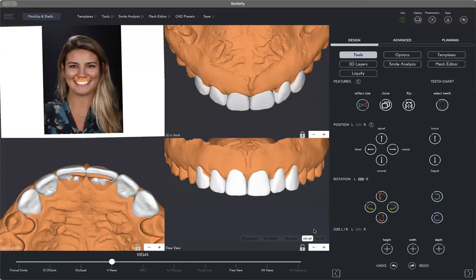everything could be fine, everything could be in the right place and in the right angulation, but it's better when we have a tool to check all the studies and all the angulations and everything in an automated way to find out every single detail and then to correct everything. And that's interesting, because from a nice smile we can create something that is very, very cool.